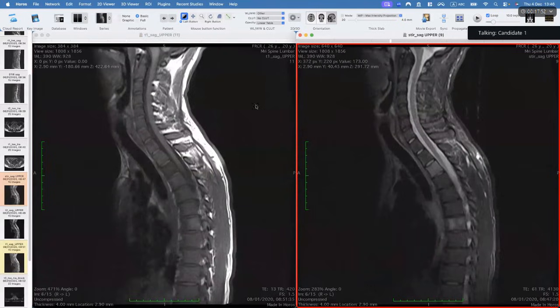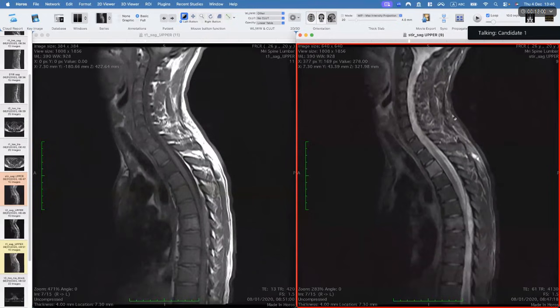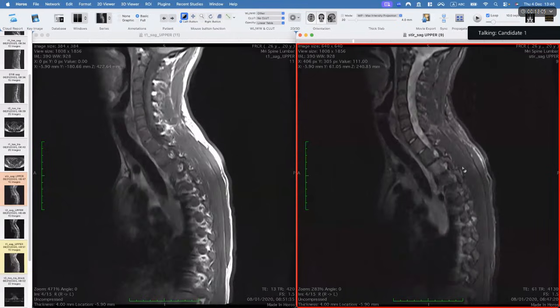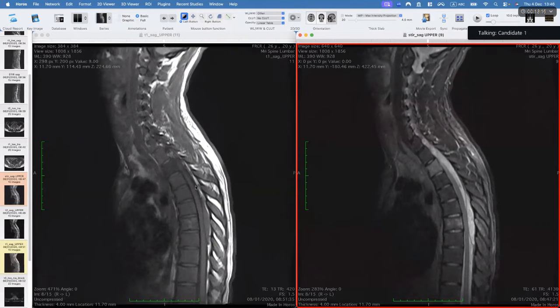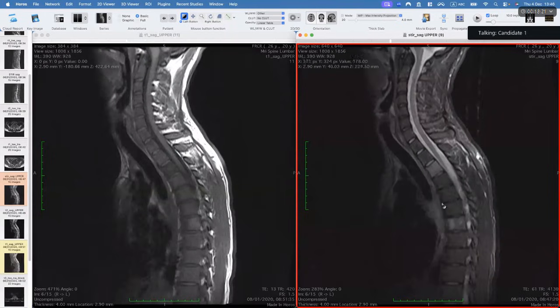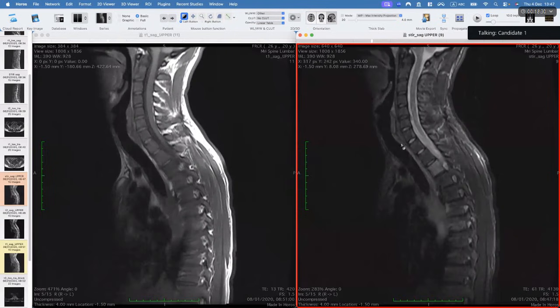Now I'm looking at the spinal canal again. There is no lesion within the spinal cord in this area, in the visualized region, and the high intensity signal on T2 and low on T1 is not extending into the posterior elements. So I'm suspecting this could be.